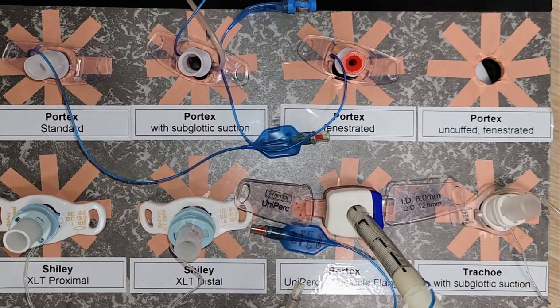Familiarizing yourself with the different types of tracheostomy tubes will help your troubleshooting process if any emergencies occur. You must remember the basic principles, regardless of the different types, however, remain the same: to provide a patent and protected conduit from the outside atmosphere to the trachea so that oxygenation and ventilation can occur.